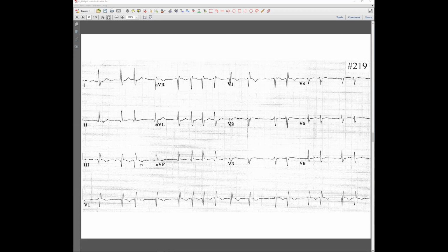If you watch the movie about the ST segment changes and other, is it the heart strain? Nope. S1Q3T3, this is how they call it. That's called pulmonary embolism. In about 20% of the cases, we do have this S1Q3T3.